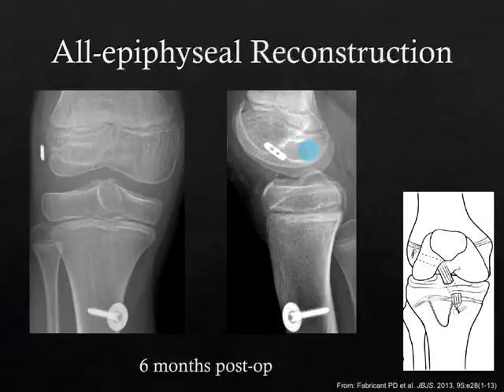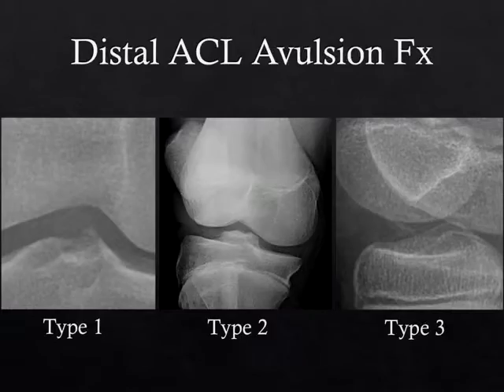So there's the articular orifice of the femoral tunnel and the articular orifice of the tibial tunnel. They're in relatively normal positions, distal to the physis in the femur, obviously, and then this cartoon on the right again depicts what this looks like. And those patients do pretty well.